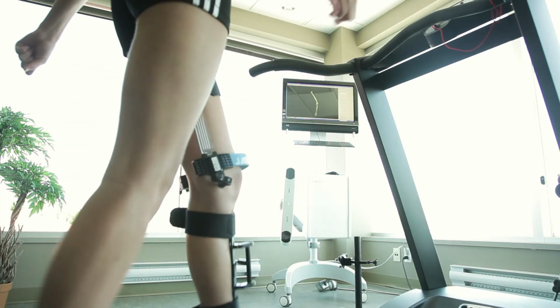For me, as an orthopedic surgeon, it's a very useful clinical tool because I treat patients, and with the current investigation techniques, such as MRI, there is a trend to treat according to images. The KneeKG allows us to better treat the function of the knee, and as an orthopedic surgeon, this is my objective.